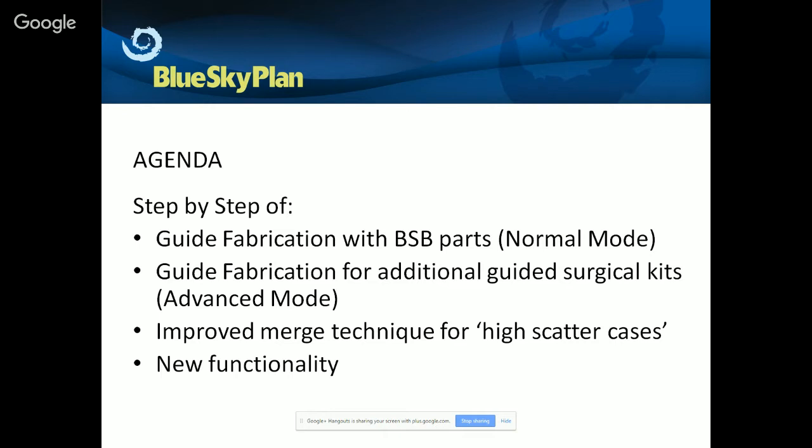We're also going to be discussing improved merge technique for high scatter cases. During the process of these three different process flows, we're going to be pointing out some new functionality in the Blue Sky Plan software for treatment planning and for surgical guide design and fabrication.